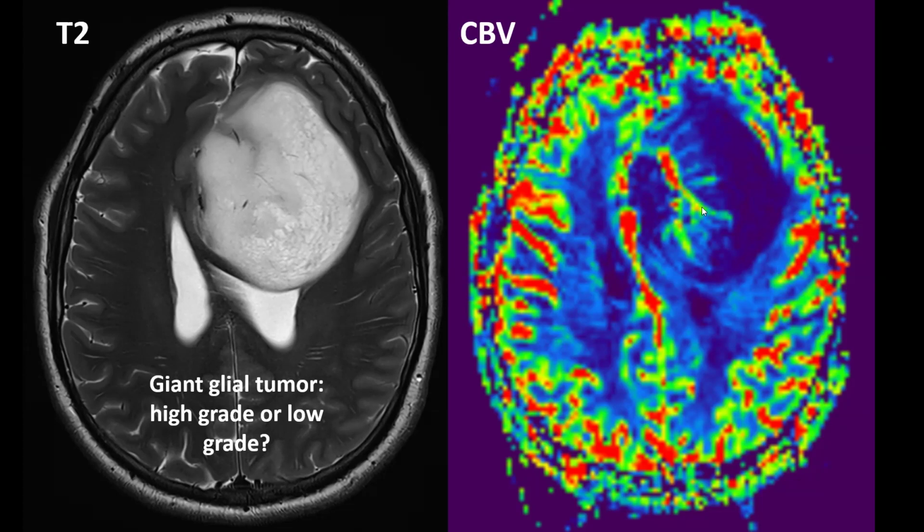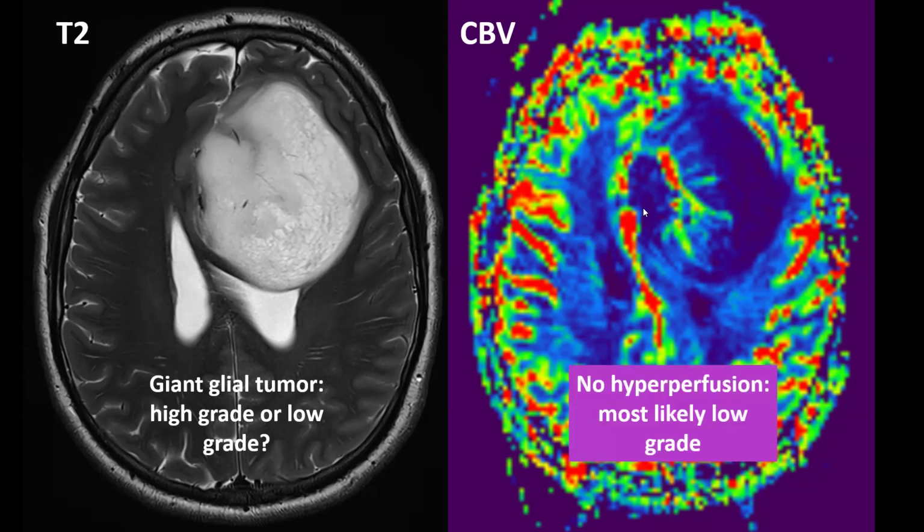Let this not confuse you, these were just some blood vessels located in this sulcus, which is a bit hidden by the tumor over here. So these are not areas of hyperperfusion. There was no hyperperfusion, so we suggested that this is most likely a lower grade astrocytoma, and it was effectively a diffuse astrocytoma WHO grade 2 tumor.